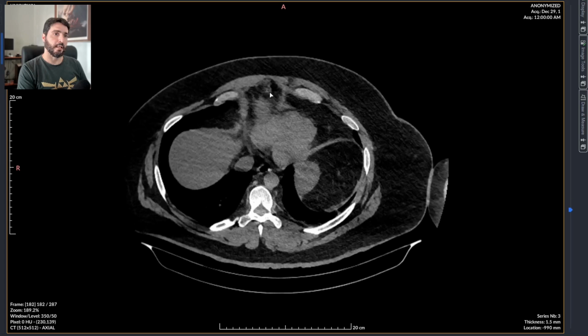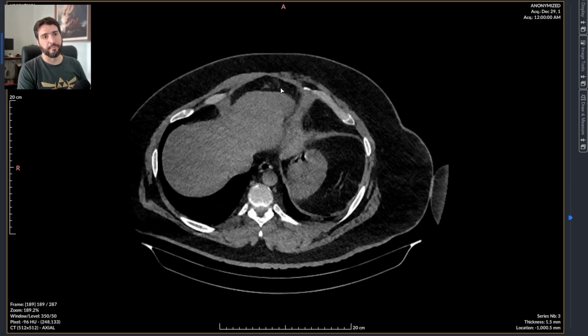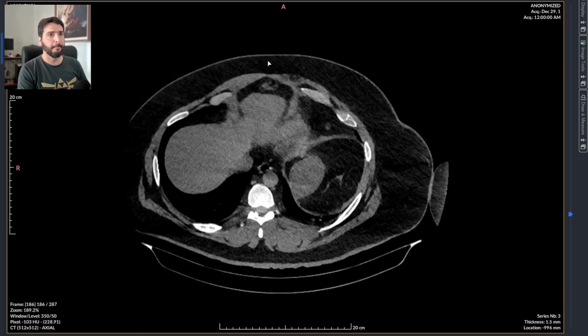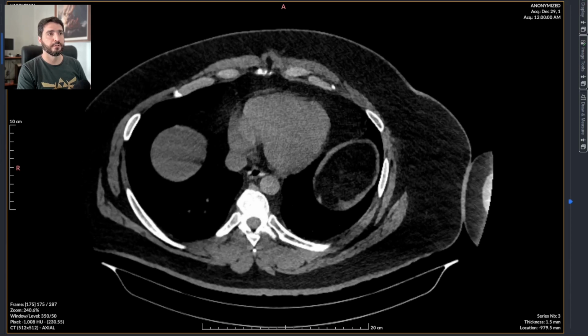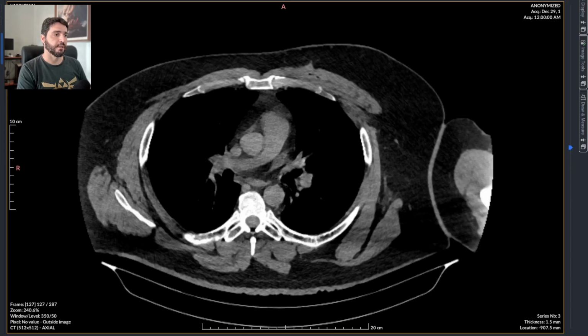There is maybe some cartilage lesion, a chondral lesion right here, and it stopped at the preperitoneal fat tissue, less than 1 centimeter, less than 10 millimeters from the left lobe of the liver, and pretty close to the pericardium and the heart. So he was really lucky when he got stabbed like this.